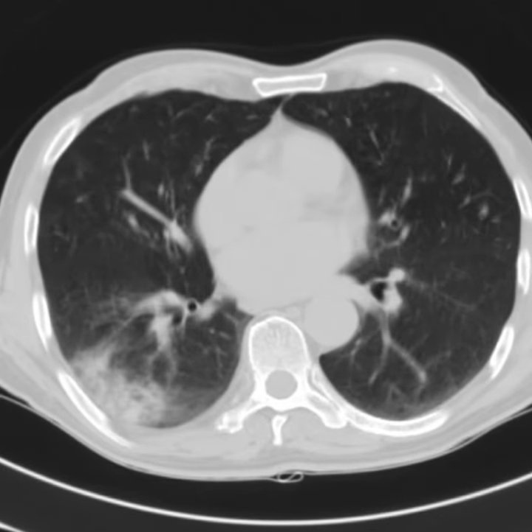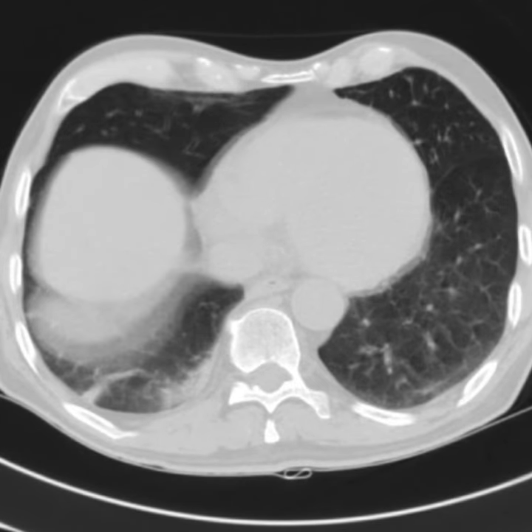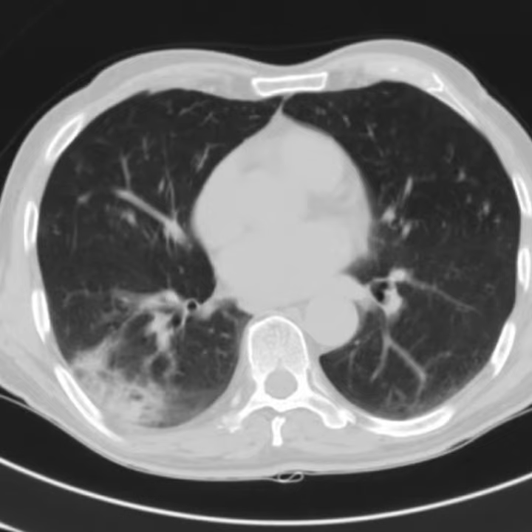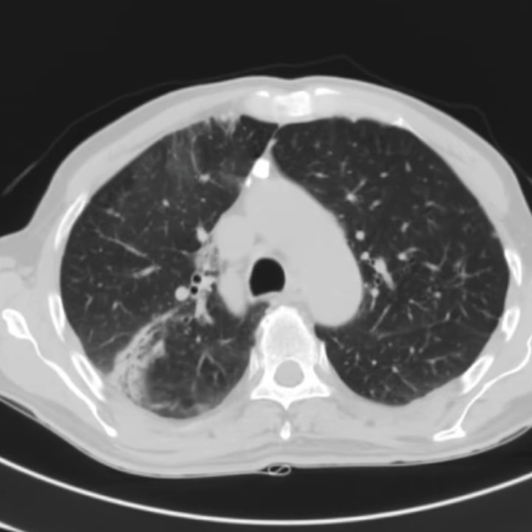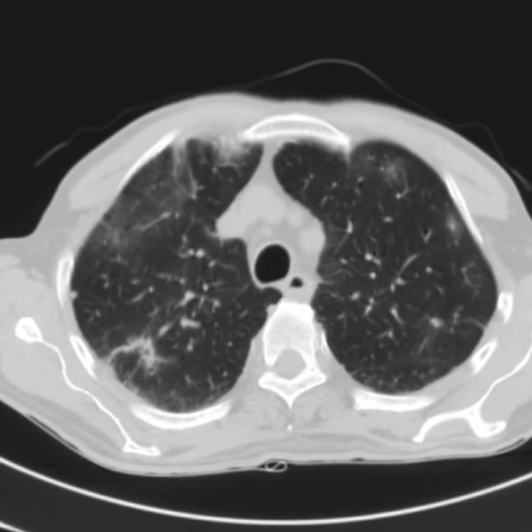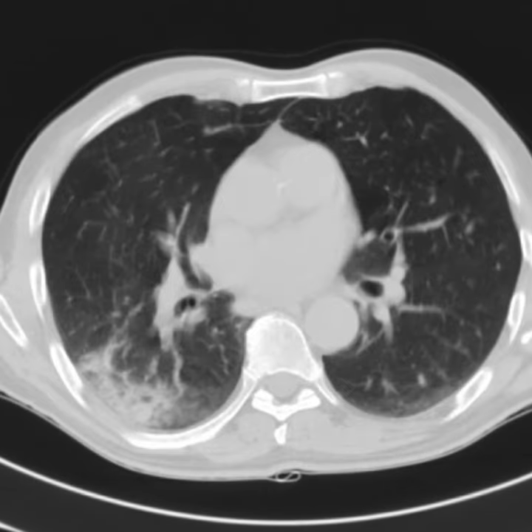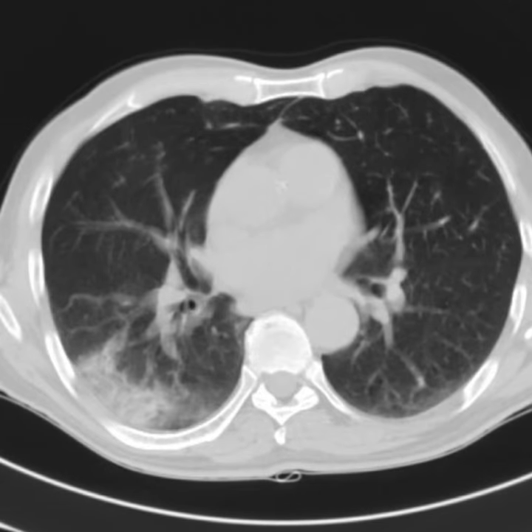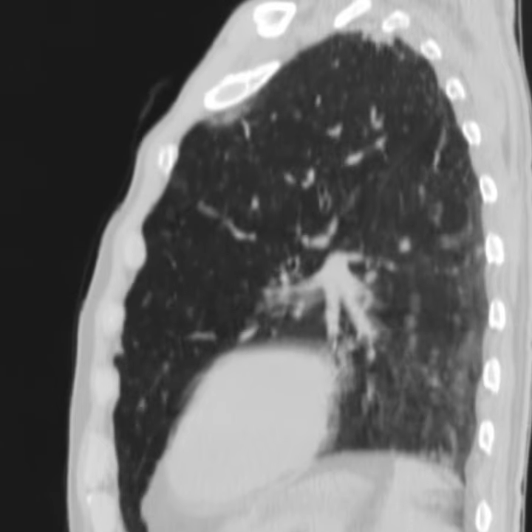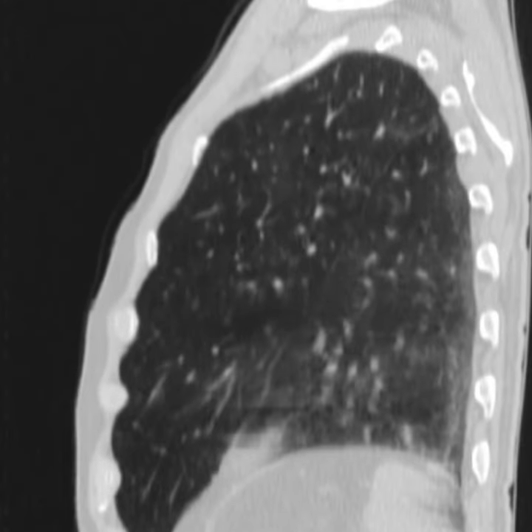Well, the possibility of interstitial lung disease should be considered. For example, usual interstitial pneumonia would be a good candidate here because of the peripheral distribution. However, usual interstitial pneumonia usually presents with apico-basal gradient. We can see that the apico-basal gradient is not very obvious in this regard.